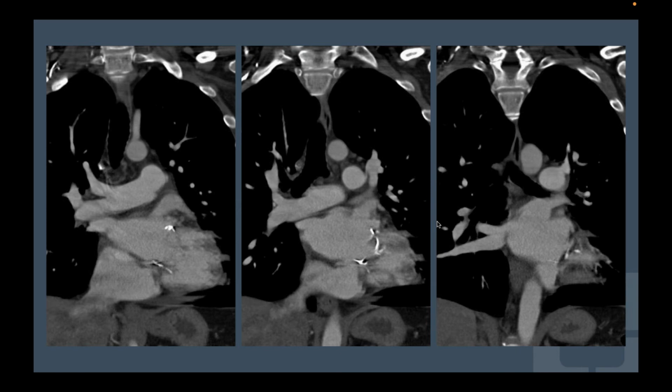I'm not entirely sure, Jacopo, but in the third image, is there some kind of communication between the coronary sinus and the LA that you're trying to show there, or is that just averaging? No, correct. And you can see it also in the middle image right here. There's a communication between the coronary sinus and the left atrium. So that's a partial unroofed coronary sinus. You can have unroofing of the entire sinus, and I have a slide on that classification. But yes, it's better seen on the middle image here, and also on the one on the right. So it's a case of unroofed coronary sinus.